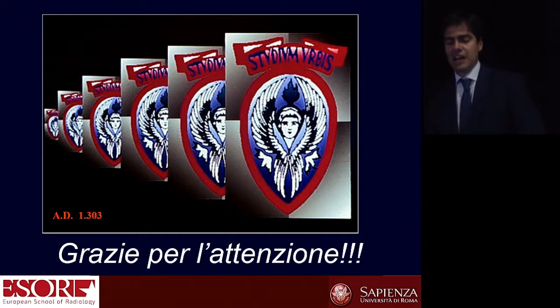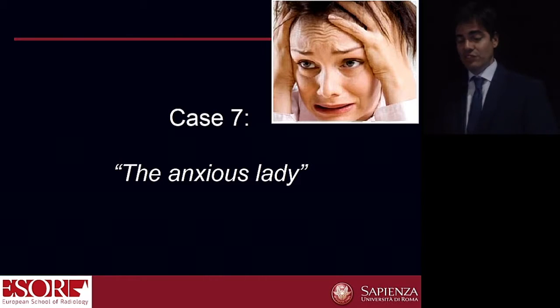This is a case, actually the 7th case I meant to present to you. I called it the anxious lady. As doctors, very often we have patients who are labeled as anxious or not before starting everything. And this lady came to do MR, being labeled by the cardiologist as an anxious, pressing patient, etc., etc.